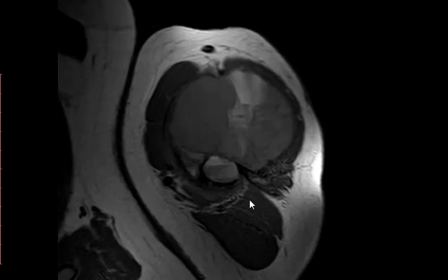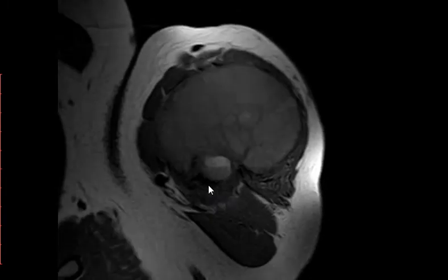Right? Stop, let's see now. Look here. Is the entire cortex intact? Okay? And we go down and it's lost here. Okay? It's expanded here, thinned, and the lesion is going from the medullary cavity into the outside. Okay?